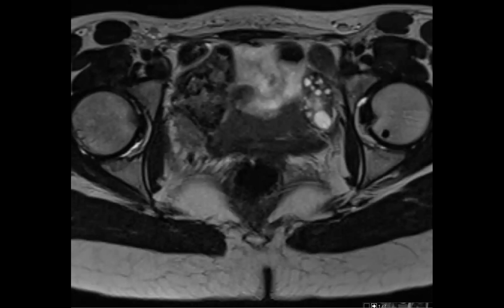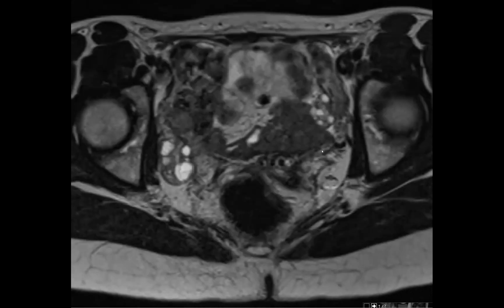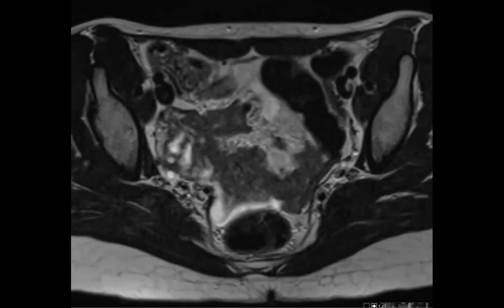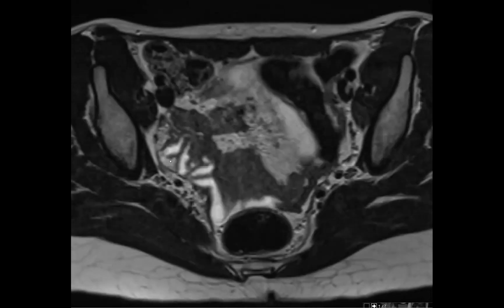I know someone out there knows it. Meyer-Rokitansky. Yeah, exactly. Meyer-Rokitansky-Kuster-Hauser syndrome. So MRKH. If you go up a little bit more, are the fallopian tubes there? Like, are those some of the fallopian tubes? Oh yeah, that's a great question. I think they're supposed to still have them. They're definitely still supposed to have them.